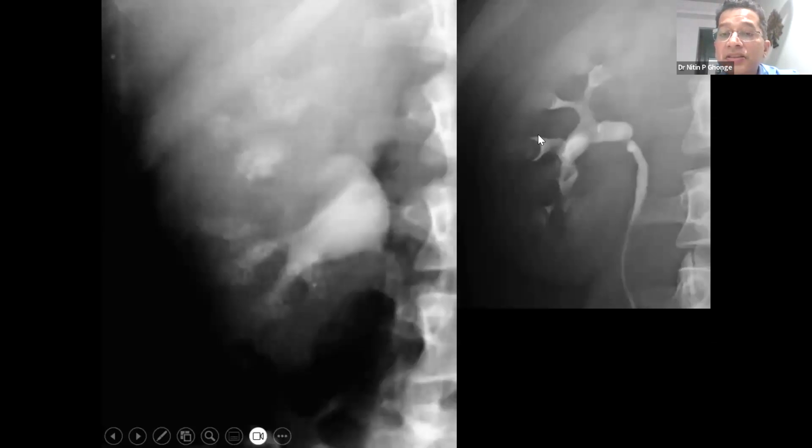So I showed you the CT urography or conventional urography showing the calyceal cup like this, as a C-shaped appearance, and you can see the normal angle like this. This acute angle should be a sign of normalcy. So this C-shaped appearance is a sign of a normal calyceal system.